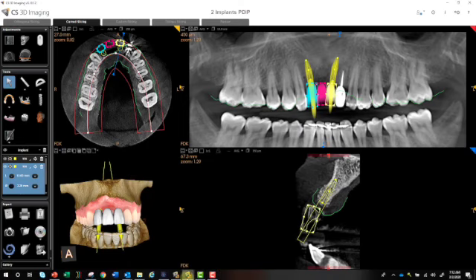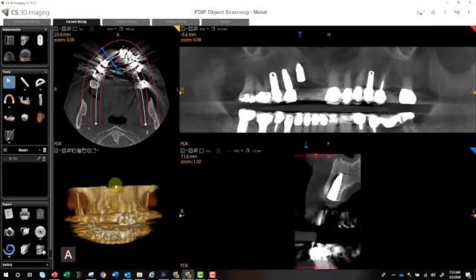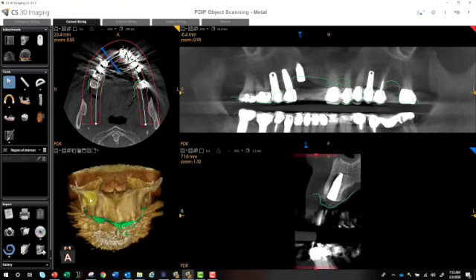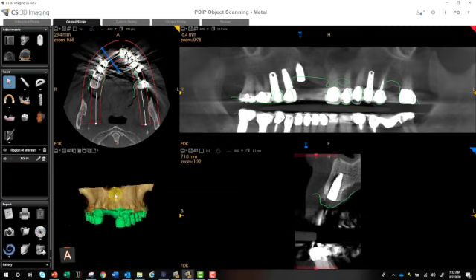Another good example of how it can be helpful to merge your impression scan and add your crowns is when you have patients with high amounts of scatter, like you can see here. In this case, I've got it pretty much all planned already, so I'm not going to show you how to do it per se, but just the value of doing it. You can see here we've merged our model, and I will show you a little bit later in the video how to use this region of interest tool, which cleans up our scan nicely.